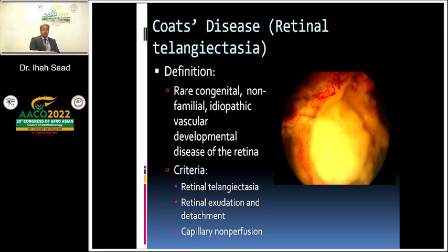And by definition, the telangiectatic vessels dilate and then constrict and then dilate and then constrict. So this is the only one thing that you really have to look at very thoroughly and very carefully. If we don't find telangiectasia, we're very much in trouble. Remember also that tumor vasculature goes into the tumor and grows exponentially larger as it feeds the tumor. And this is a huge difference between Coats and retinoblastoma.